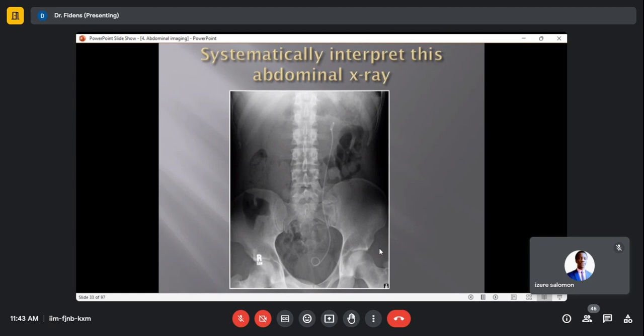Okay, let me go to soft tissues. About soft tissues, I see some problem you have said is about this cecum. I see that the cecum has become bigger, and I can also see the ascending colon above the cecum.